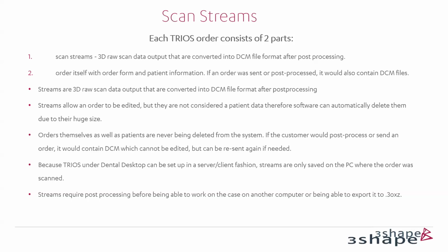So you can see that scan streams are like the 3D raw scan data output, as I mentioned here, that are converted to DCM file format after the post-process. The second point about why it's important is that the order itself comes with the order form and patient information. So if the order was sent or post-processed, it would also contain some DCM files.